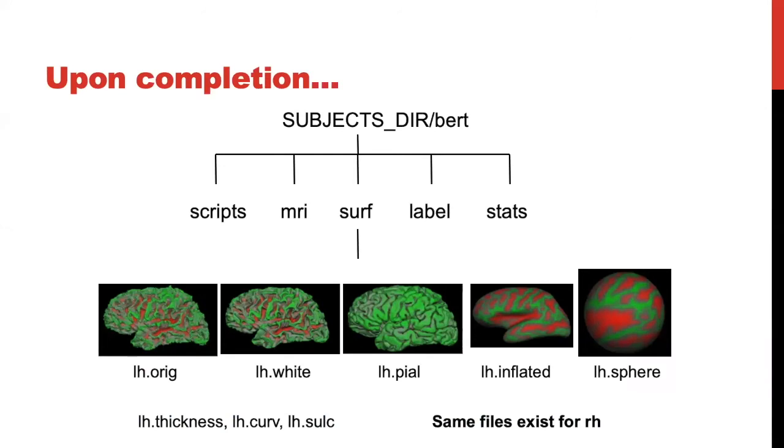So like I said, FreeSurfer gives you a lot of different volumes, and nicely enough, it will separate those for you. So MRI is strictly the 3D volumes, but you can easily recognize them as an MRI of a brain. And then surfaces are that more 3D volume that you can turn around and make all kinds of fun presentations out of. This is where you can see how the brain has been inflated and what those surfaces look like.